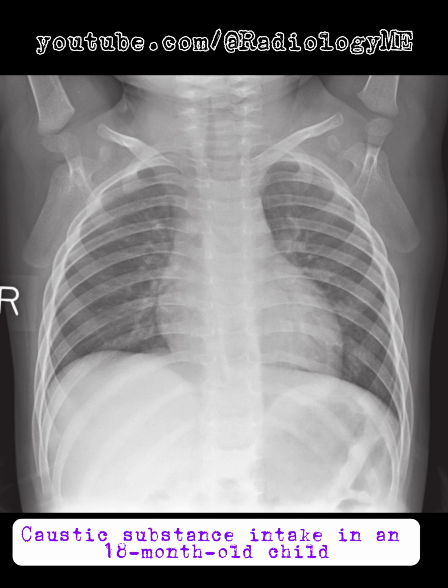In this case, we're looking at a frontal chest radiograph of a young child. The first thing that catches my eye is the presence of the characteristic steeple sign. This is indicative of narrowing in the trachea, where the normal shoulder of the air column has been replaced by an upturned V shape, suggesting a narrowing of the upper airway. This is a classic sign associated with croup, or acute laryngotracheobronchitis.